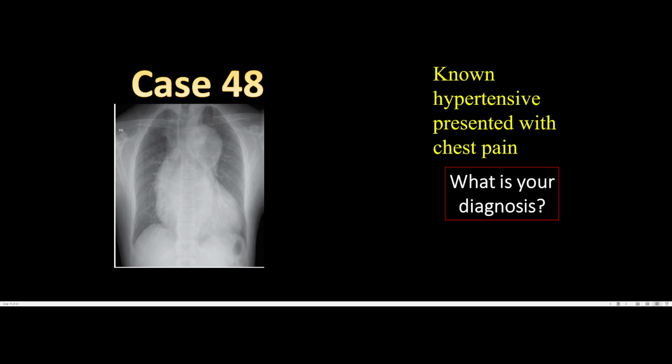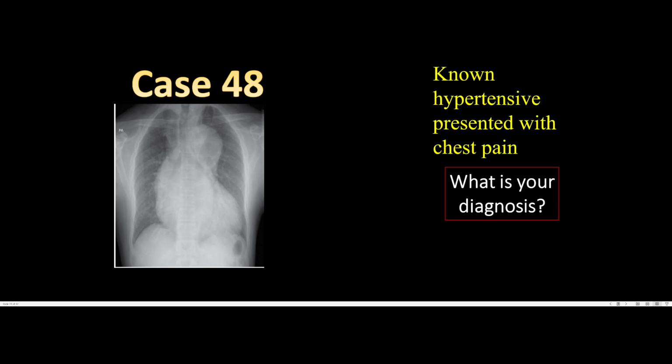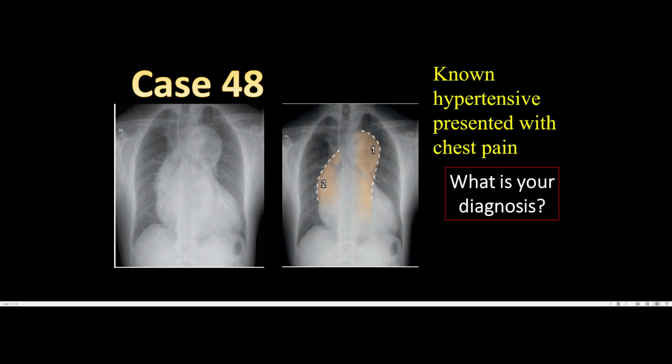All right? So mediastinal widening, where there's widening that is basically projecting outside this one and this one, you want to think of bleeding, most commonly aortic dissection. All right? If there is focal mediastinal widening, then you think of focal causes, mediastinal masses. But here we're thinking of bleeding because there is widening diffusely.